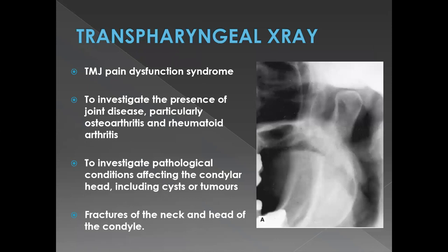Oh, I'm sorry, I forgot about the last X-ray. This is the transpharyngeal X-ray. The transpharyngeal X-ray was quite commonplace again before the advent of the OPG. If you look very closely at this picture, you will think that you're looking at a cutout of an OPG, but this is actually not. This is not an image that has been cropped from an OPG. This is actually your transpharyngeal X-ray.